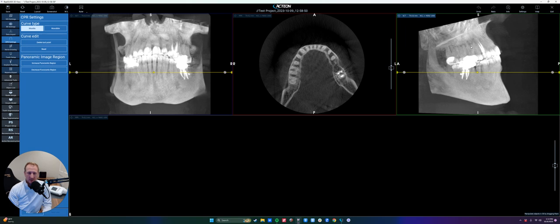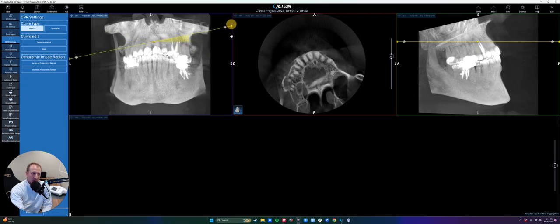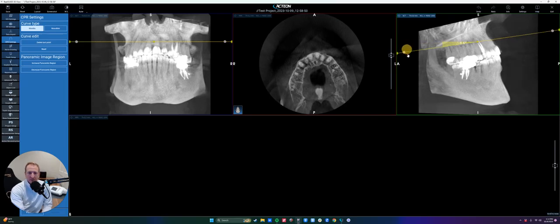In this example, the patient is tilted just a little bit up. We can see their occlusal plane has a little bit of a tilt to it. First thing I'm going to do is click, and that will move my planar line up. Now we're in the maxilla. If the patient were tilted left to right, I can drag this line to be even with the occlusal plane or the patient's true horizontal Frankfurt plane, right? On this one, since we're looking at the AP tilt, I can tilt this back and see that I'm trying to make this line close to the occlusal plane, okay?